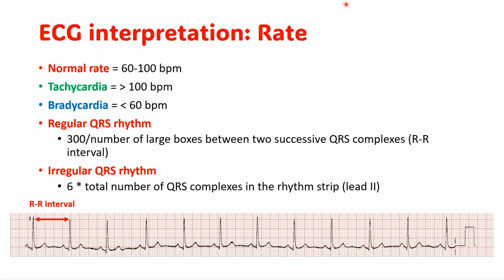And I mentioned this in my video about atrial fibrillation, where that's called a rapid ventricular response, where we tend to have a high ventricular rate in response to a high atrial rate.